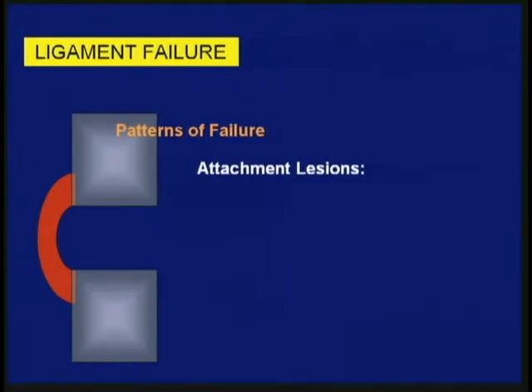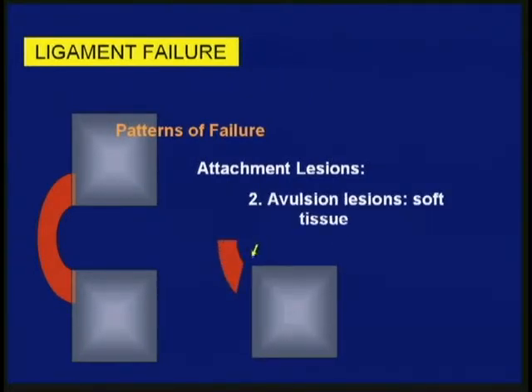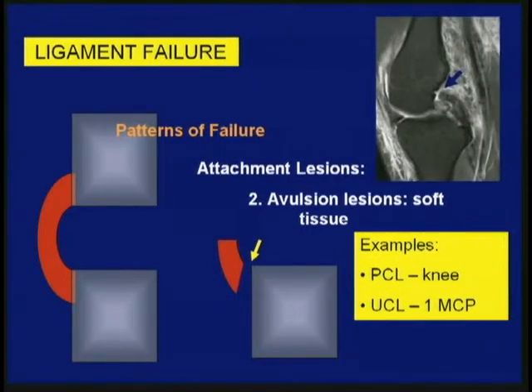So this is a peeled back lesion at the attachment site. The second pattern of failure that occurs is a partial or complete detachment through the ligament at its site of attachment. This is an important injury to note. Here I show it with a posterior cruciate ligament failure right at its femoral attachment, because at least theoretically these are easier to repair. You reattach the structure. Big difference than an intraligamentous pattern of failure. So you have to describe this on your report. These are uncommon, both with the posterior cruciate ligament and with the anterior cruciate ligament. Intraligamentous failure is more common.